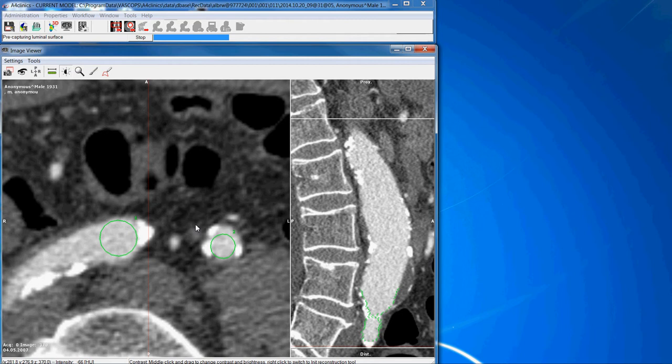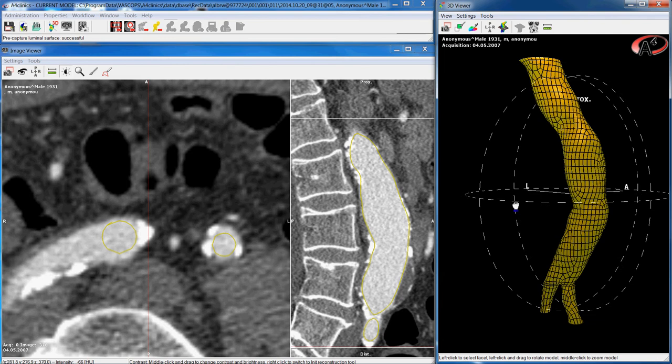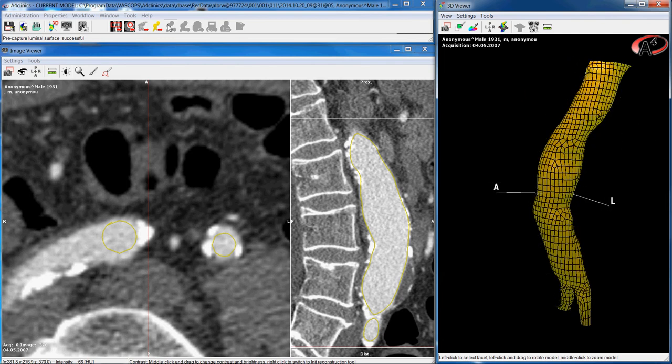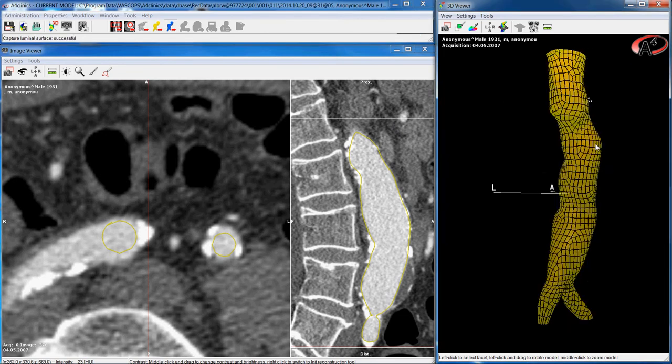So now a snake model will run slice by slice through my image data, and when this step is finished, it provides my three-dimensional pre-segmentation, which pops up here in the 3D viewer. Next, we're going to refine this information and start the balloon model to segment the luminal surface. The balloon model will then provide the fully three-dimensional segmentation.